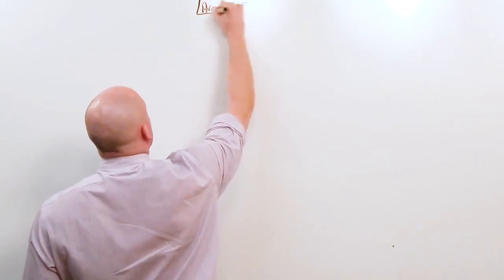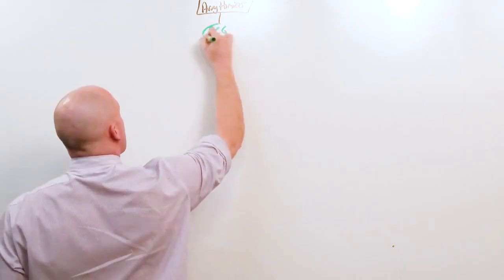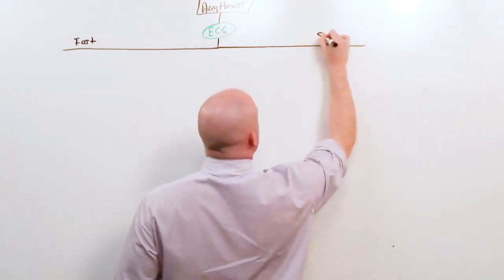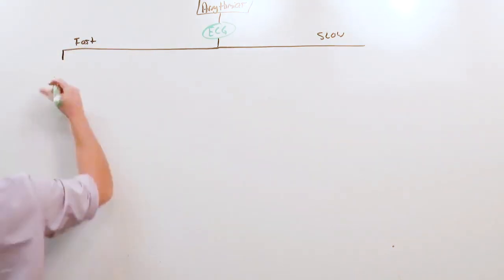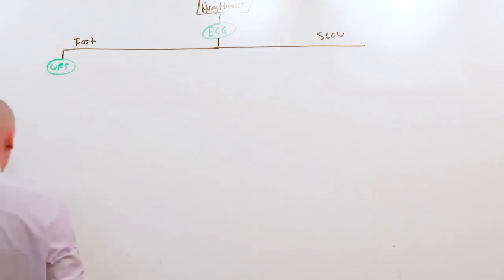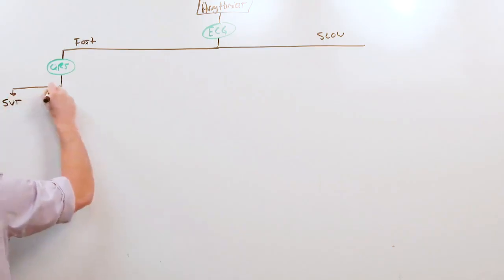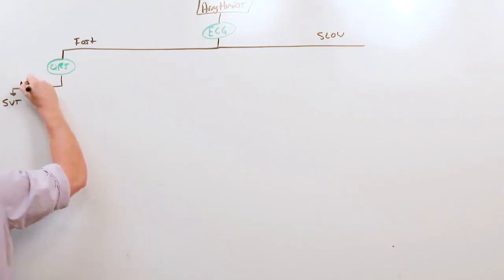Arrhythmias, of course, are going to be diagnosed based on an EKG. And the first categorization you need to make are those that are fast and those that are slow. In the fast category, the next thing you need to look at is wide or narrow QRS complex. A normal QRS complex is less than 3 little boxes, 0.12. And the narrow arrhythmias are going to be supraventricular tachycardia and AFib flutter. These are narrow complex.